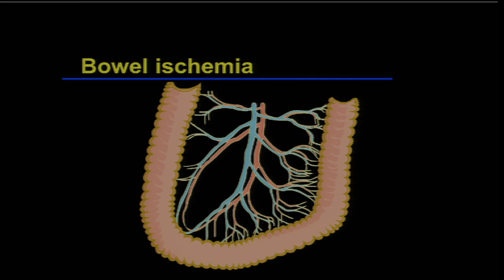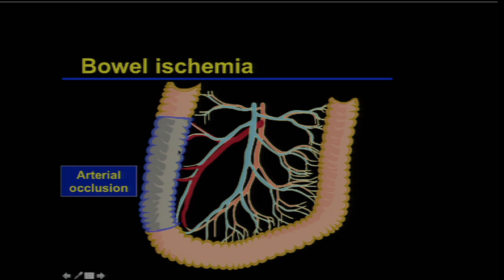So just a cartoon, this is a summary. If we were to block an artery, what would happen is the bowel would become very devascularized quickly, would not necessarily become thick, and this would be non-enhancing. Sometimes we get recanalization via arcades from adjacent bowel, and we'll get enhancement of the mesenteric blood vessels first, or the mesenteric wall, and then we'll have the antimesenteric wall take on the appearance of shock bowel.